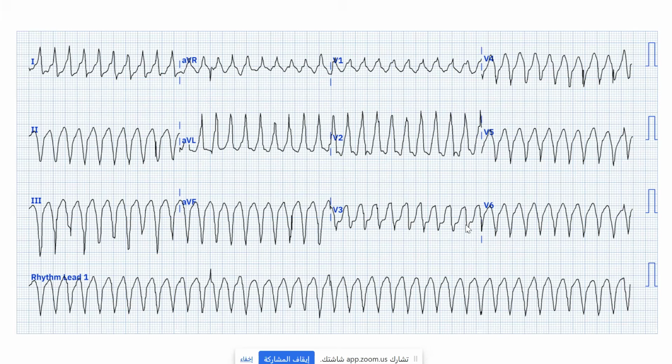So we have a long list of differential diagnoses. Which kind of tachycardia is this? Is it VT or some other wide complex tachycardia? This is VT. If I am in the ER, I will consider it VT. But why?